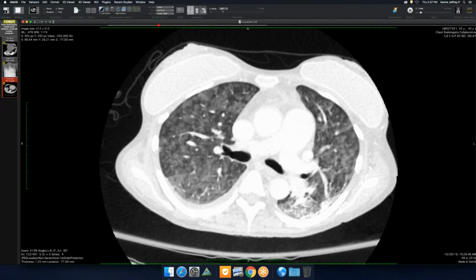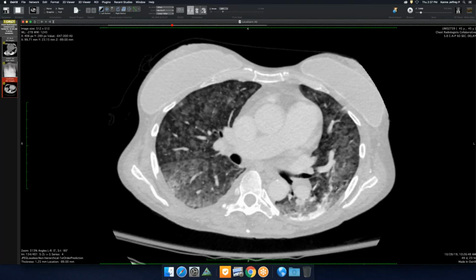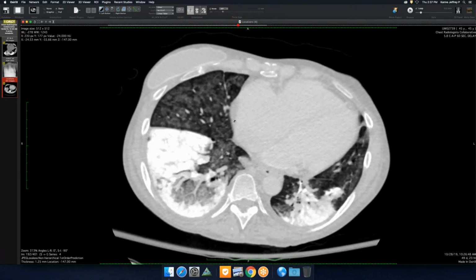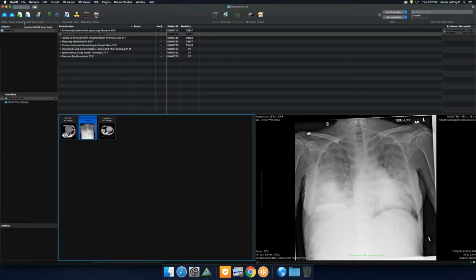I saw a recent case that somebody showed me. It kind of looked like this, except it was more focal. And I always wonder too if there's some sort of acute insult that injured the lung in some of these areas, and is it a combination of tumoral calcinosis plus metastatic pulmonary calcification? Maybe so. Yeah, it's hard to know. The gradient's kind of odd like this, and long-standing myocardial involvement as well. But that just was kind of interesting.